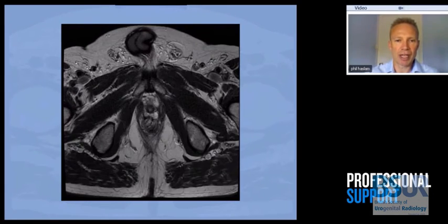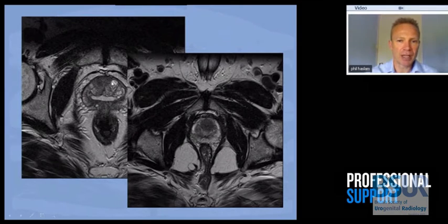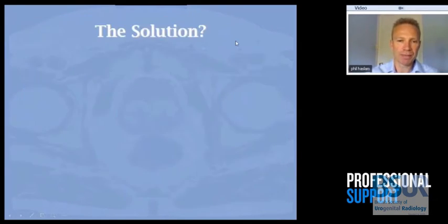I'll just show you another example. This patient's had TURP. You can see the TUR cavity here, but anteriorly here is an area of low signal. And again, this patient's biopsies have come back negative, as had this patient here, this area of low signal anteriorly, involving predominantly the transitional zone. Again, I think that's suspicious for tumour.